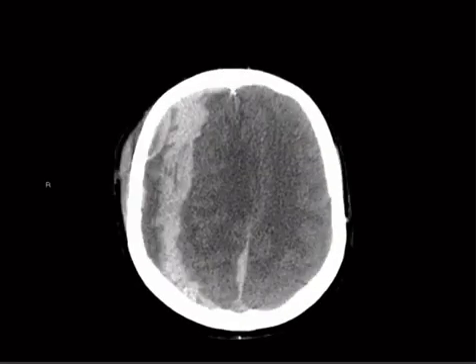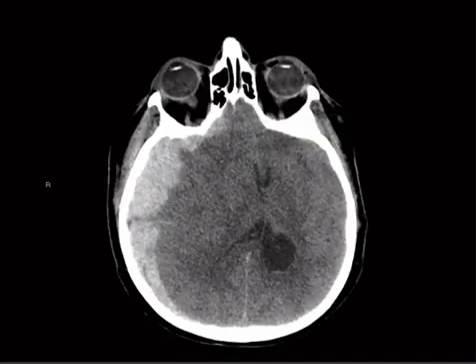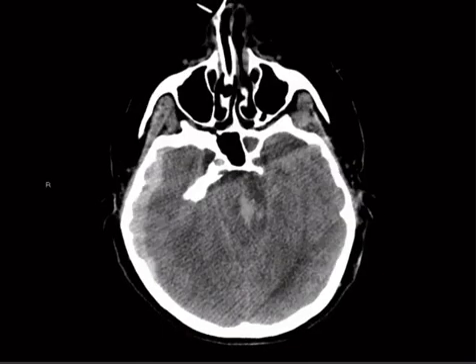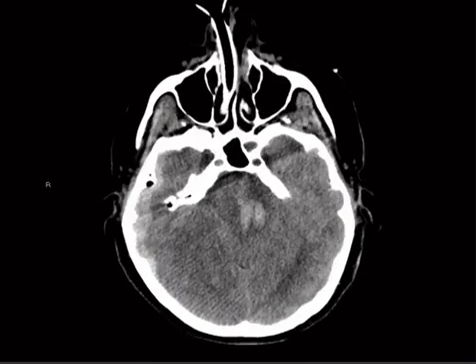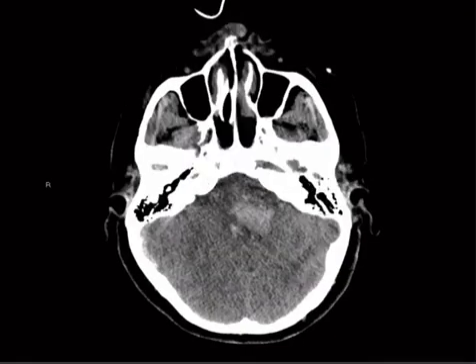Here's another one. So this is a scrolling case here. In a pie we're seeing there's a lot of blood here, subdural and probably maybe an epidural component as well. A lot of midline shift, that's key. And then as we move down here, there's bleeding both in the pons and the medulla that maybe isn't related to the injury that caused the blood higher up.